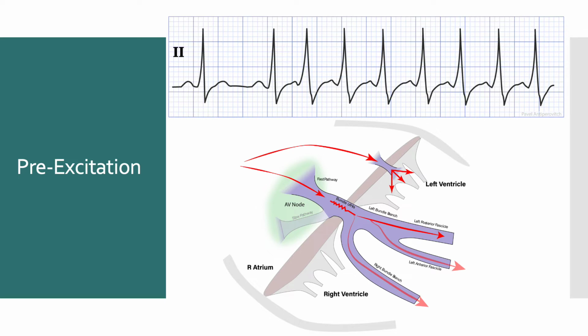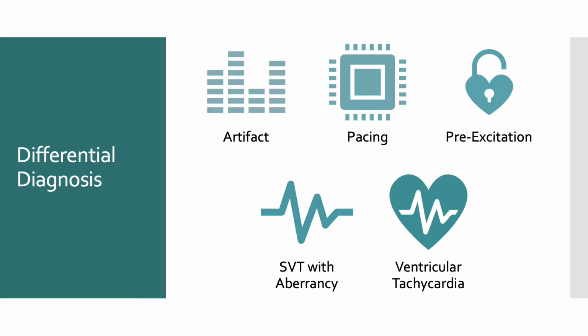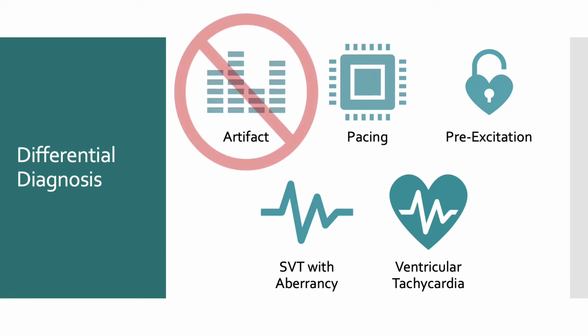So in this particular example, you can see there's a sinus QRS, which is pre-excited, and when the tachycardia initiates, it produces the same pre-excited QRS that's ongoing. So this is an example of a pre-excited SVT. When we look at this patient's 12-lead ECG, there's clearly baseline pre-excitation, which raises our suspicion for the diagnosis of pre-excited SVT.